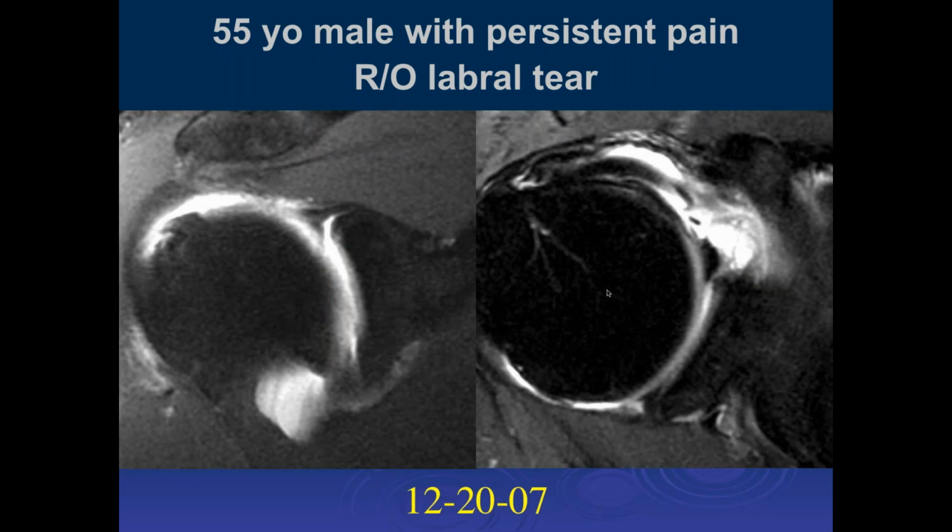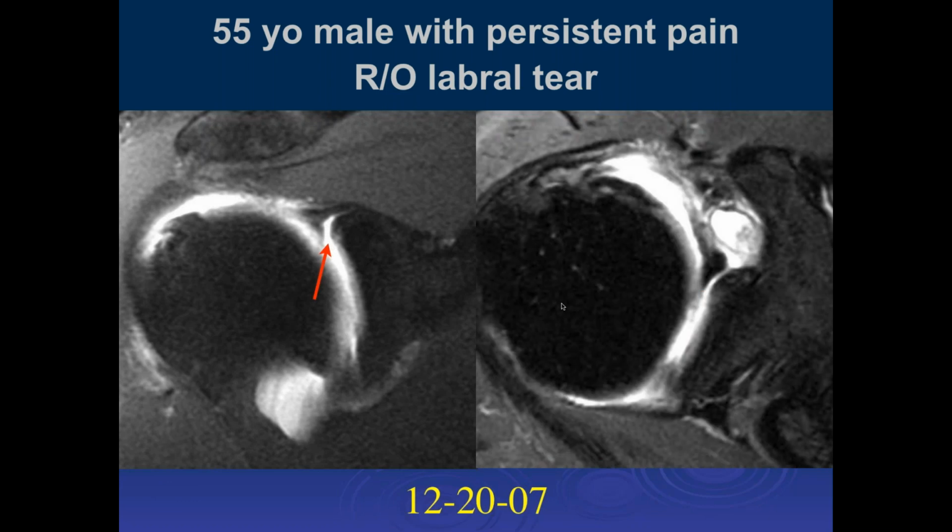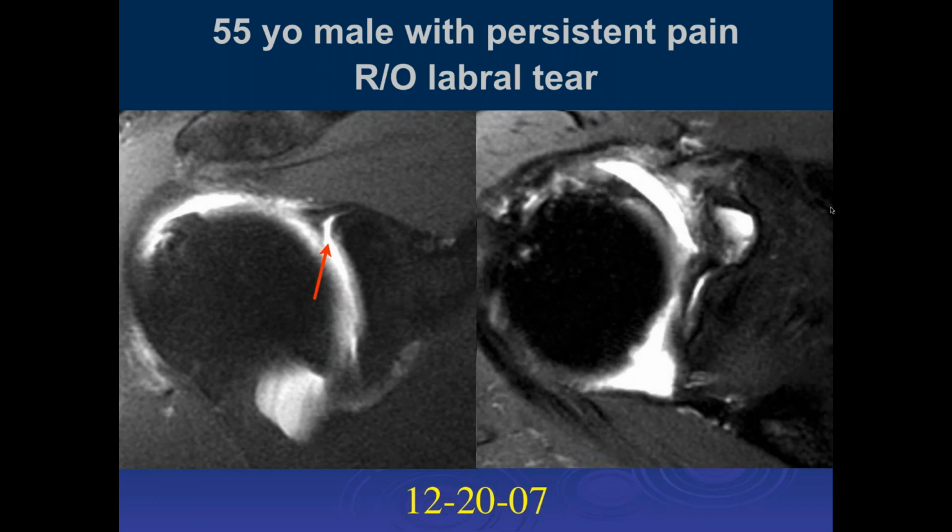What do you think here? So this looks like an arthrogram. Okay. And yeah, we see the sublabral recess, well delineated, smooth margins. There's no signal going into the superior labrum, so that would just be a normal recess. And here are some other images. I have to be a little concerned when you have fluid over here, but we'll talk about that later. Here we can see what could be a recess. So this is 12/20/07, and this was called a superior labral tear.